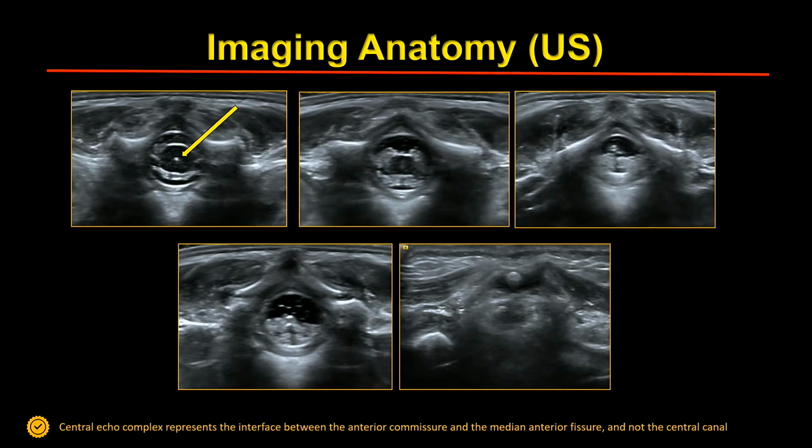The transverse images are also very important to assess the posterior convergence of the posterior elements. We can also see the filum, the cauda equina nerve roots. Some people do dynamic imaging. They place the patient prone and they place the patient on left lateral decubitus, both sides, and see if the cauda equina nerve roots can move freely. So that's also an assessment for tethered cord.